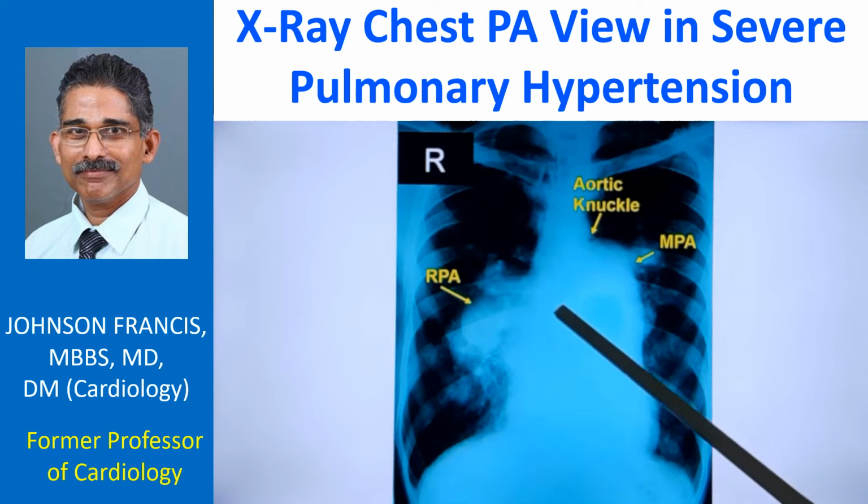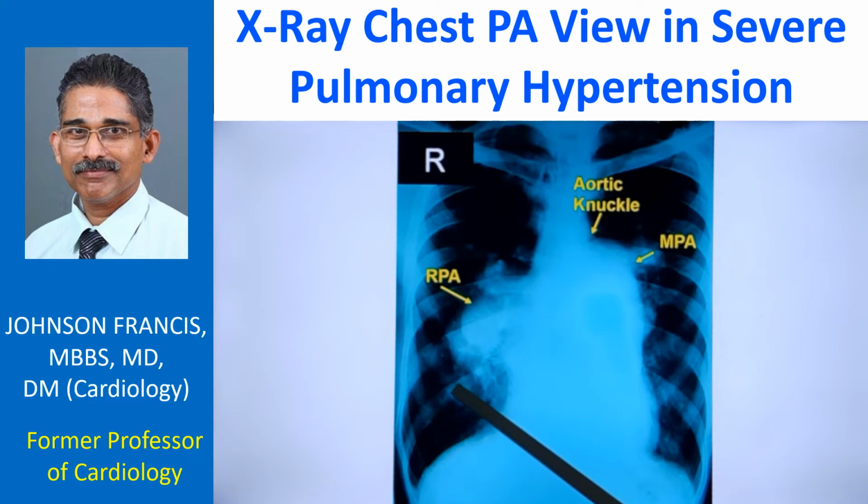Probably this could be an end-on view. This also could be, but you cannot be very sure about it because this is the region of the overlap between these two ribs. So we will not be very sure whether this is an end-on view.